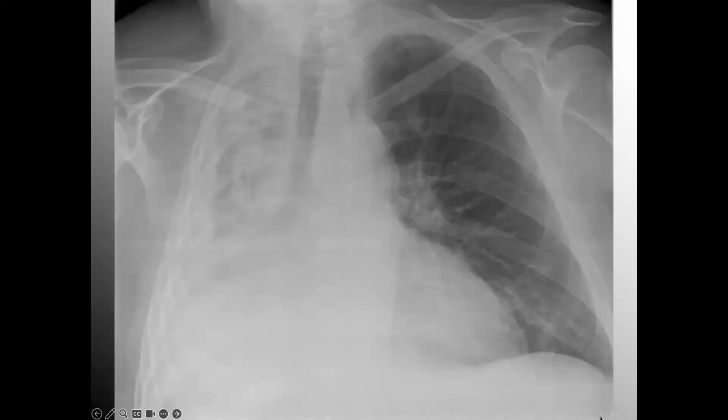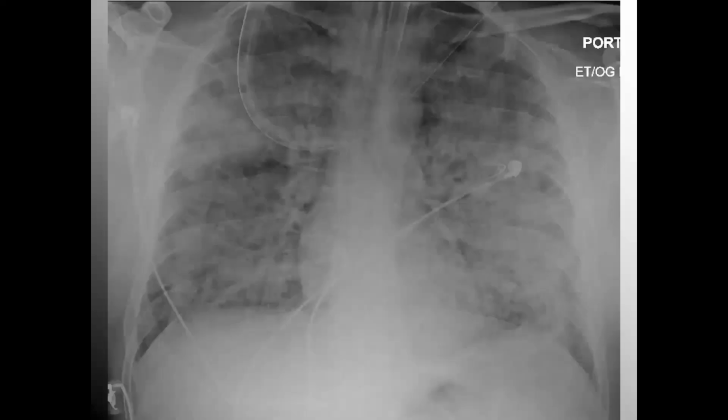Now, one more thing in passing before we move forward. In this patient, you do not have compensatory hyperinflation necessarily according to lucency, but you do have an increase in vascular markings and interstitial markings. This patient is a fluid overload nightmare with atelectasis atop everything else. I suspect they're going to need thoracentesis. They may need mechanical ventilation, but they're going to need diuretics and some other things. But we're not really talking as much about treatment today, although it is tempting.